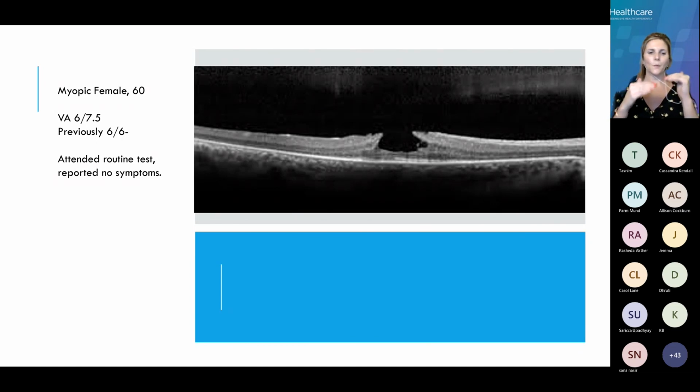So I've already said that when you're looking at this, it's always important that you scroll through on your pre-screening scan from left to right the whole way along, because especially with this, and you're all guessing quite rightly what's happening here, we'd want to make sure that the posterior hyaloid layer isn't visible and isn't still attached at any point, because obviously that still has a tendency to pull. But if the posterior hyaloid layer has come away and this has caused this hole, which as you quite rightly said is a lamellar hole, this means that this is unlikely to change.